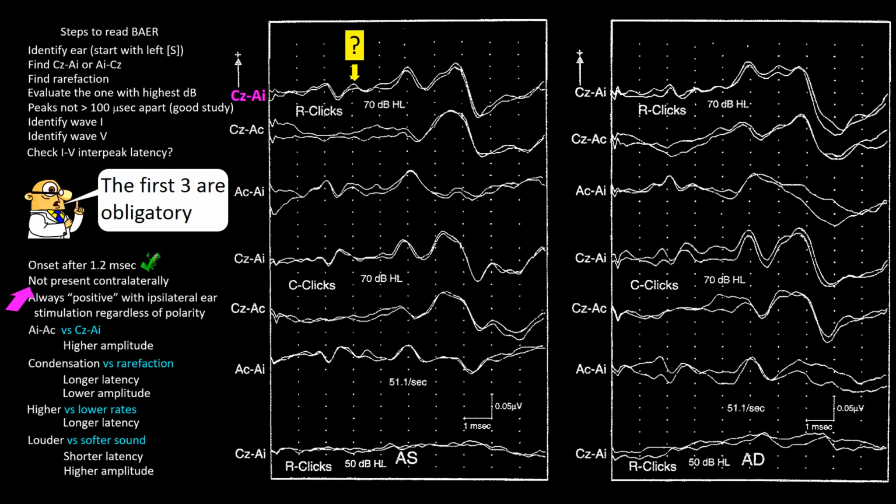Next item is there is no wave on the contralateral derivation. As you can see, no wave is present contralaterally. So this criterion is also met.